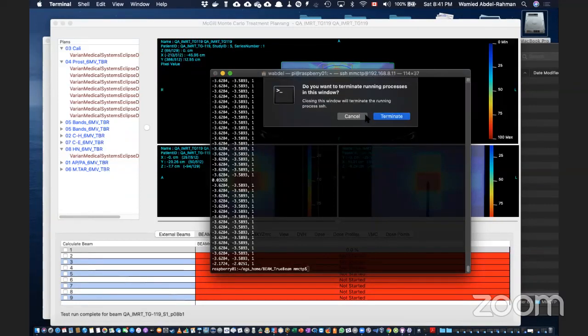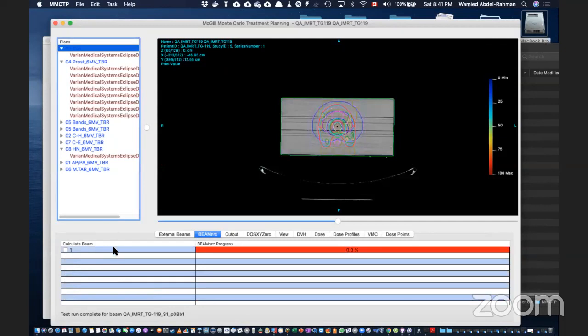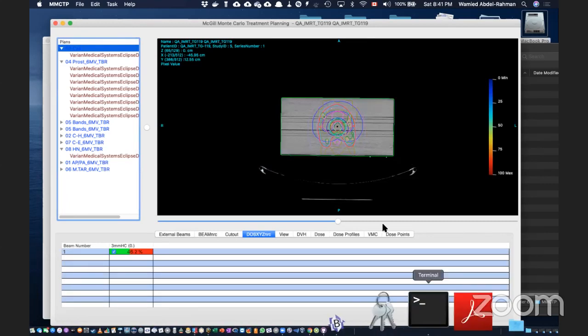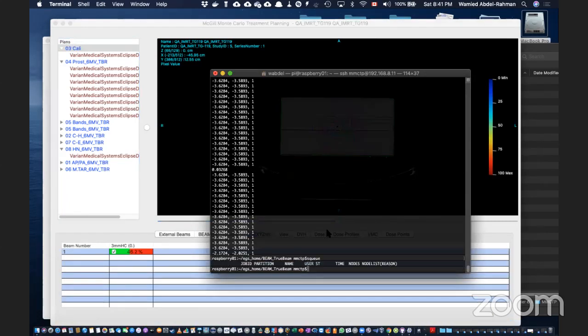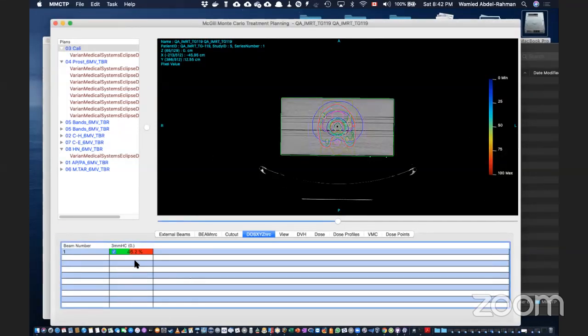Okay, so let's go back to here. Let's see if this has those XYZ. So let's see if this has finished. So SQ. Okay, so I don't find anything in my queue. So now the next time is going to check.